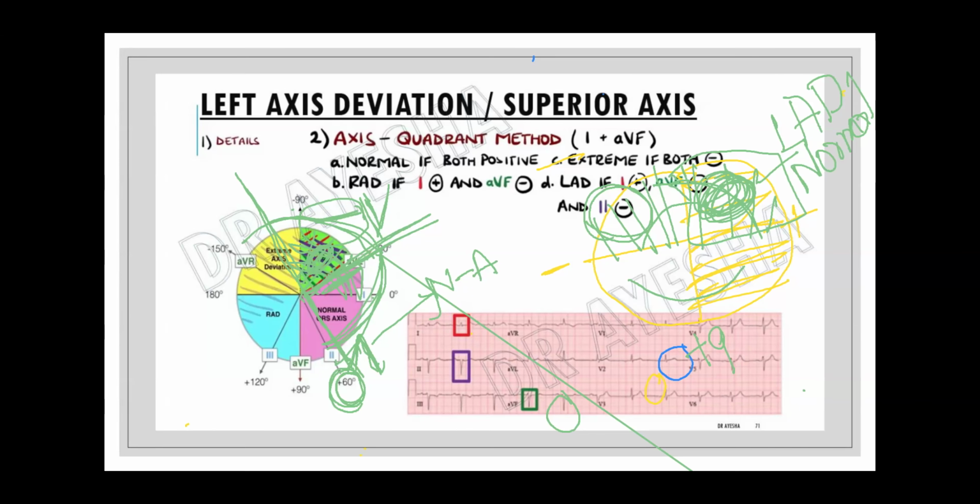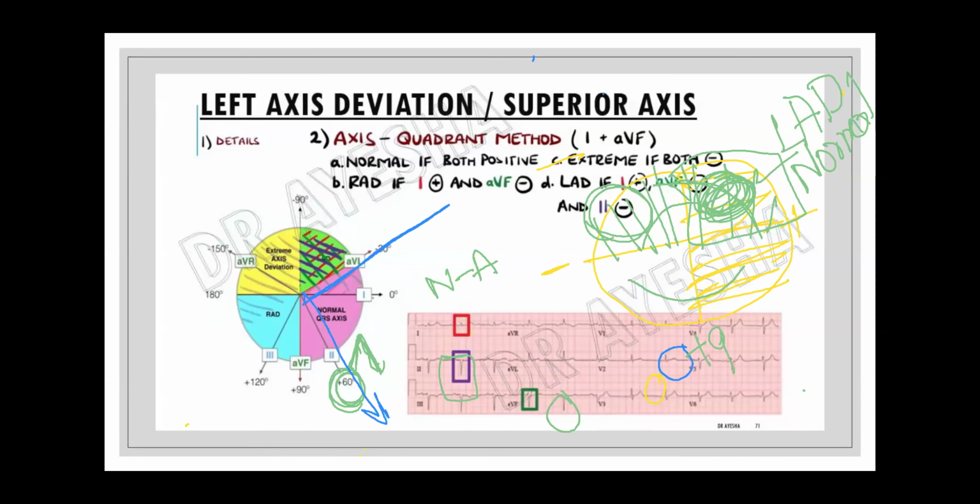So what I see in lead 2, in lead 2 you got complete negative. So the lead 2 direction is this. Let me clear it again. The lead 2 direction is here. You make a perpendicular like this. Toward this you have positive, and above it you have negative. So the negativity is lying in the left axis deviation column. So if lead 2 is negative, it is confirmed that it is lying in left axis deviation. Is this clear to everyone or not?